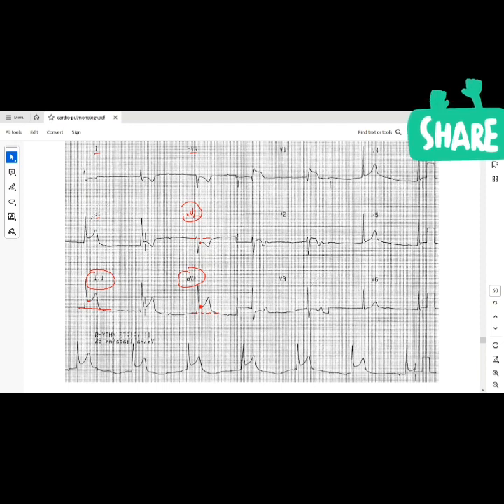And look at lead 2. Doesn't lead 2 have ST elevation as well? Yep. Okay, so you have to be systematic and read everything. So what you can do is start from this point, go this way, then come to the next level, read everything this way, go to the next level and read that way so I'm not missing anything.